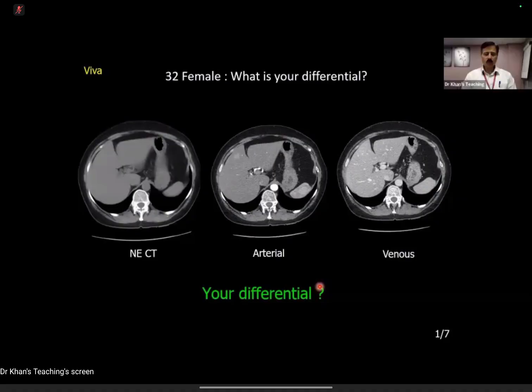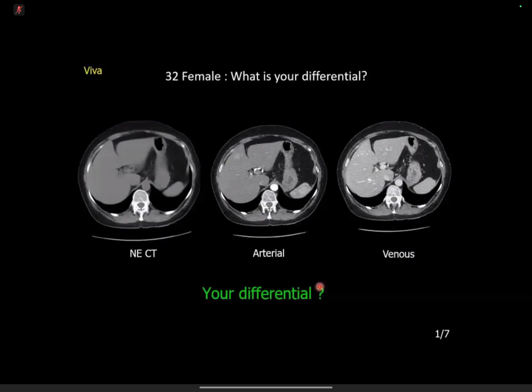Right. So what is your final differential now? So my final differential would be an FNH.